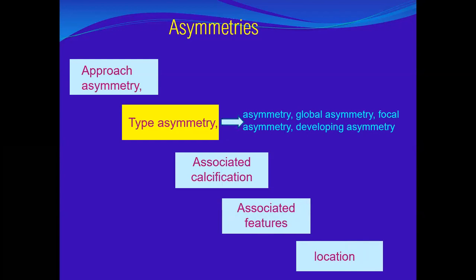So the type of asymmetry, we describe the focal. And what about this one? It could be a developing.